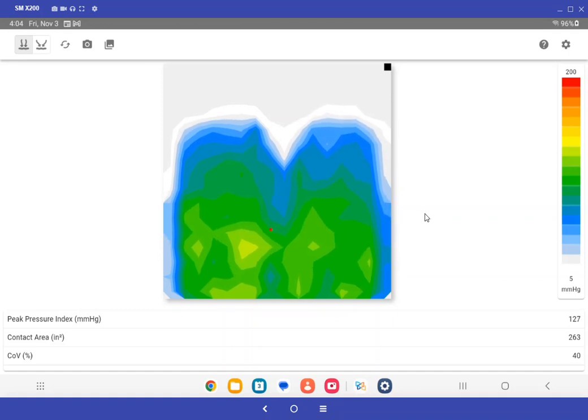If you're sharing this with other users, be kind. If you go in and change some of the settings, make sure you switch it back to what it was before you leave. That's the extent of the settings available in the BodiTrak2 Lite system.